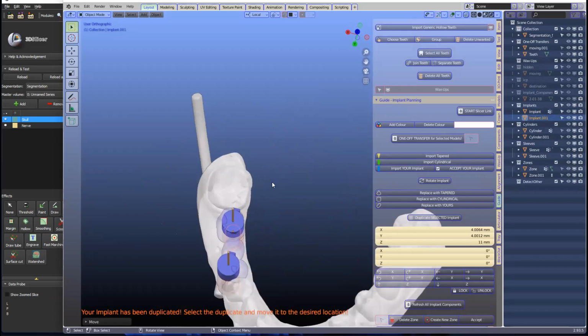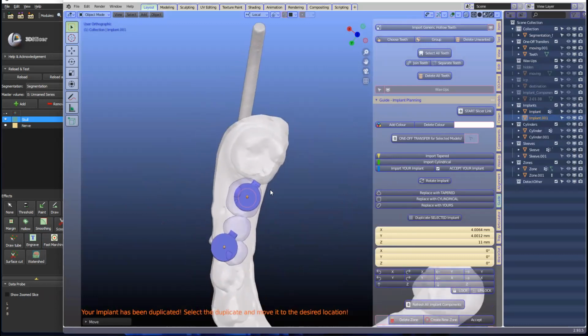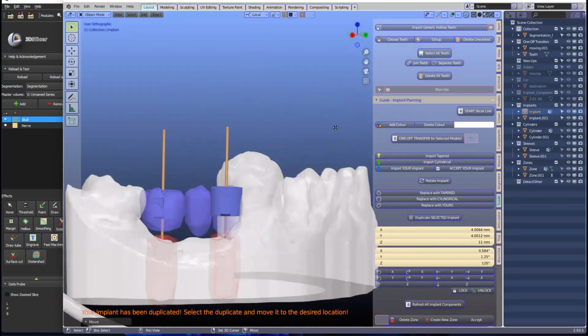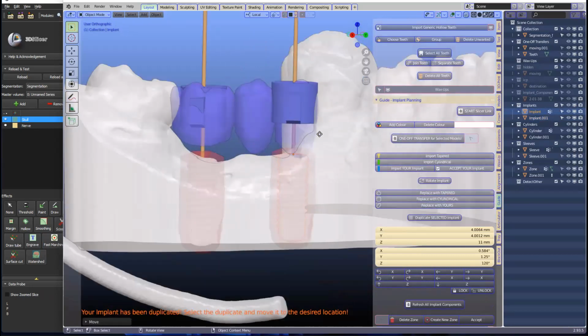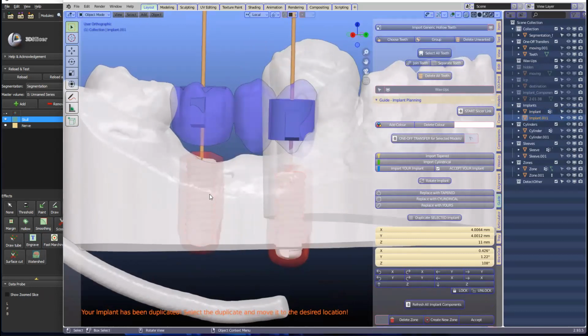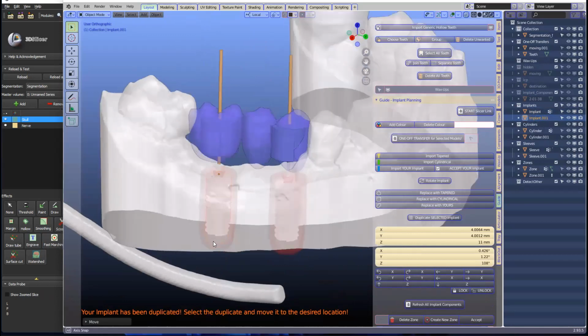Wolf, can you just explain this notch here that we've got? Yeah, so that's the timing notch. In case you need to angle an abutment, you take the abutment to a certain turn, and that notch is the indicator of that in case we want to use the angled abutment.